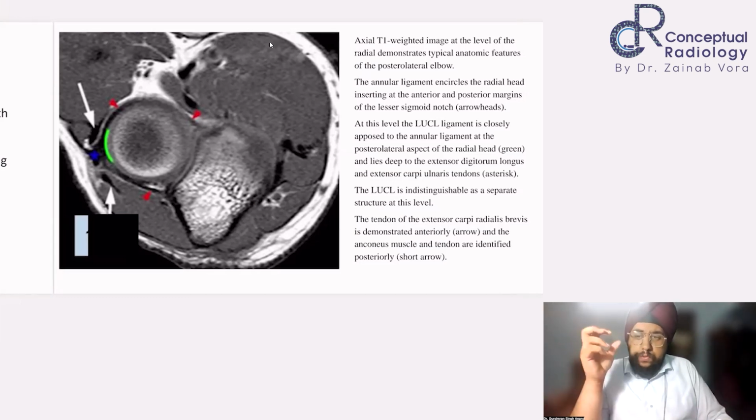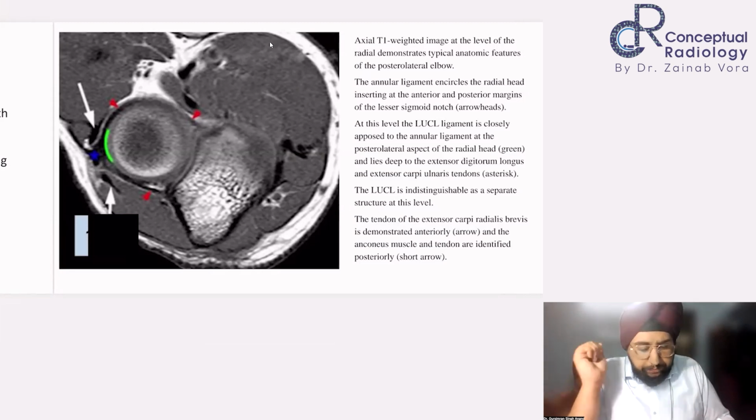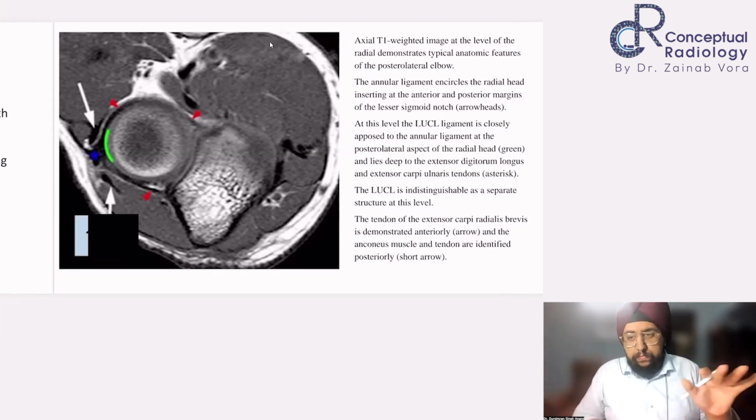So in the context of adult traumatic injuries, including the ligaments of the elbow joint, you will never find a tear of the annular ligament. This is different, obviously, in the pediatric population, which we'll be covering in the next class. Okay, that was my point.